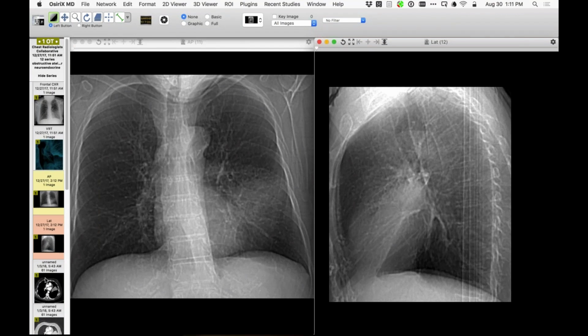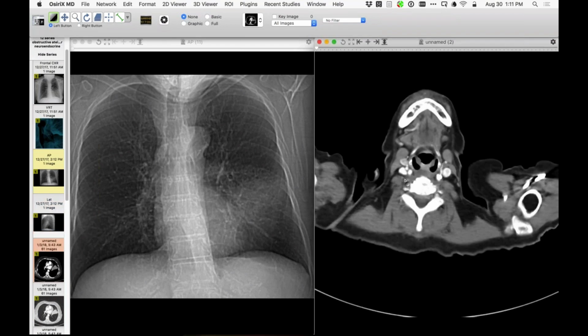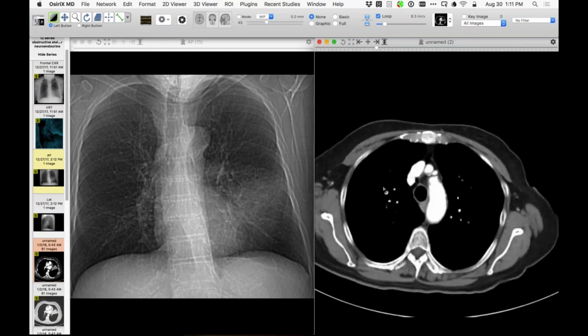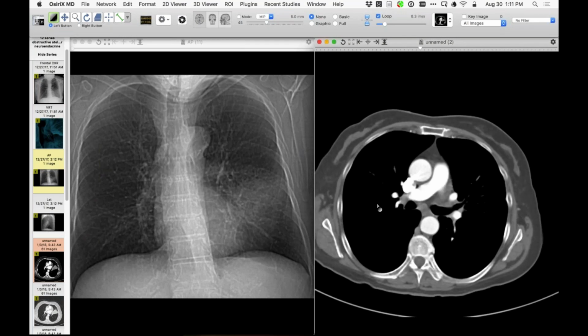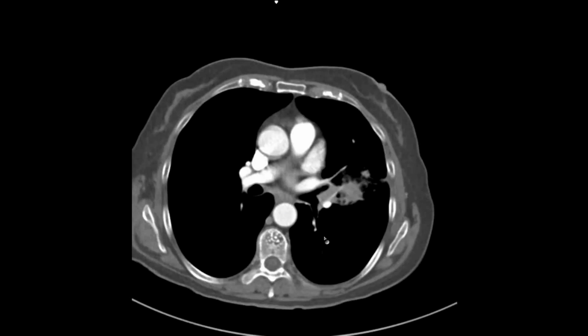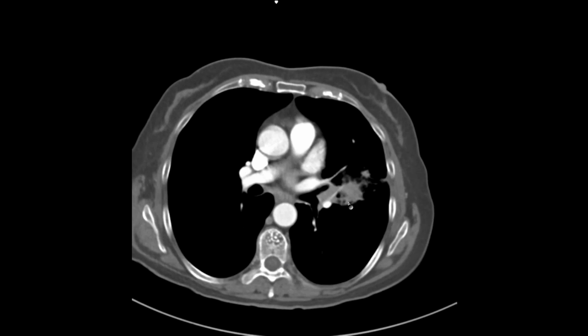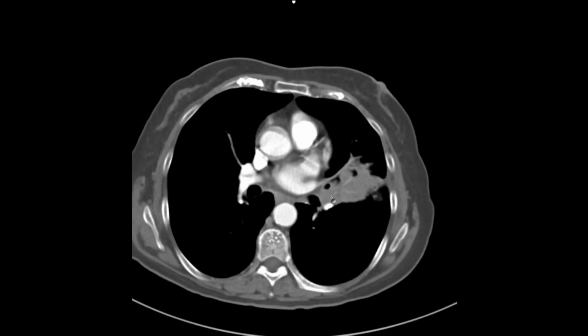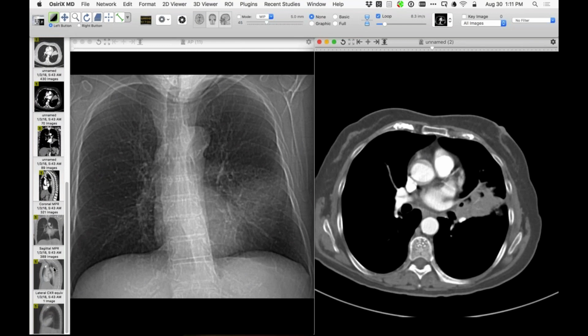And the etiology of that opacity is an obstructive phenomenon. So I'll bring up the CT, in which we have a relatively unusual situation where we have an obstructing lesion, but it spares the left upper lobe bronchus, and really just gets the lingular bronchus. So here we have the spared upper lobe bronchus, but here we have the opacity in the lingula, and this bronchus is obstructed right there. And this turns out to be, on bronchoscopy and biopsy, a small cell carcinoma located there.